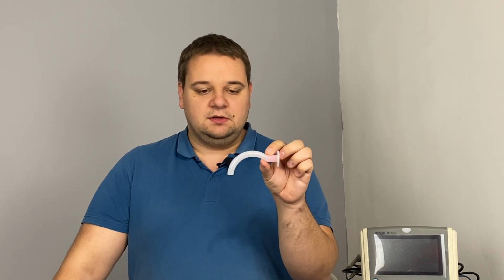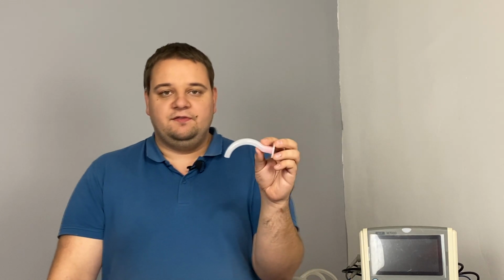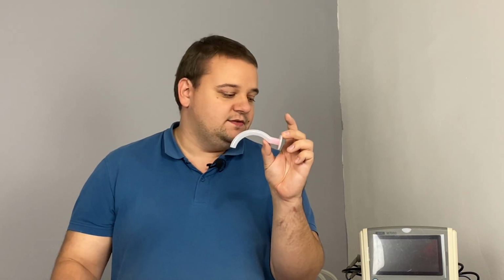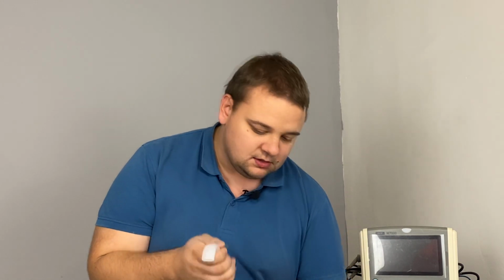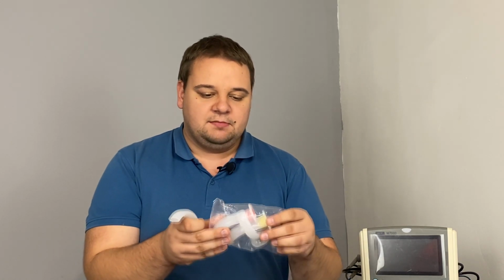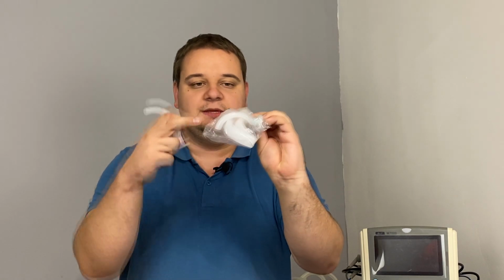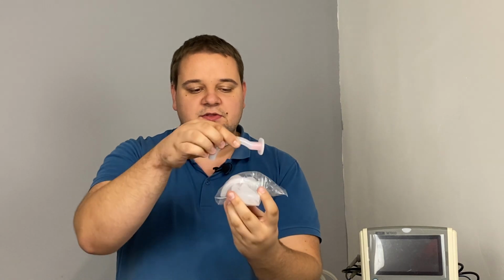Why is this device useful? It's cheap, so you may find it in a big variety of crash carts and first aid kits. It can be used by anyone. There are different sizes of these devices. For example, this one is for adult use, and if you let me, there are devices of different sizes. You see that there are different colors and they're smaller. For example, this green one is for children. You can compare its size to the red one for adults.